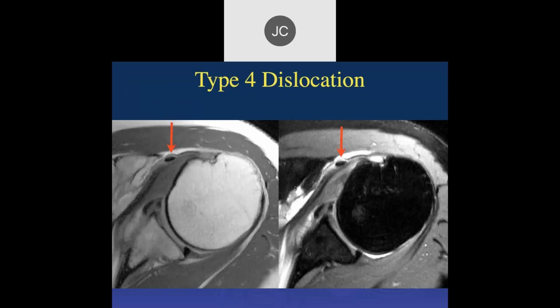So do you think that transverse ligament is a scar at that point right there? So the question is, is the transverse ligament scarred in here? My guess is it kind of tore through the transverse ligament, and there's probably a little membrane that formed there, but it's probably not a full ligament. One thing to remember, like we talked about the other day, the transverse ligament is quite long from superior to inferior, and it may be not a complete dislocation distally. It may be more complete as we see here, more proximally. Okay, thank you.